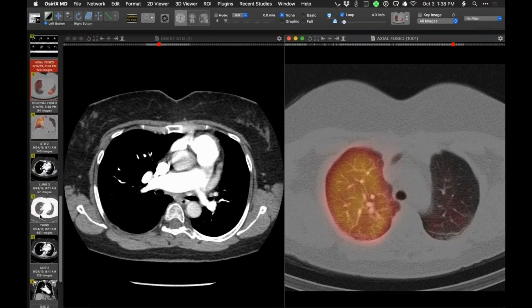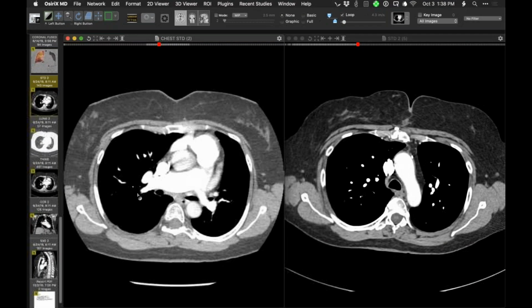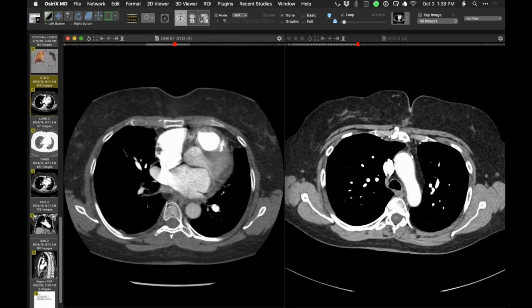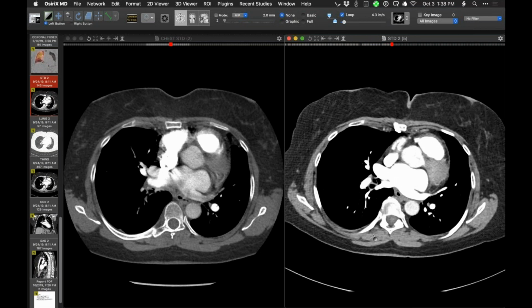So then she went to surgery, and let me just pick up the one that I have here, which is this one. And this is the most recent one. So let me go back to, for example, here, where we have dramatic occlusion of pulmonary vessels here. And you'll see that that opens up surprisingly nicely.